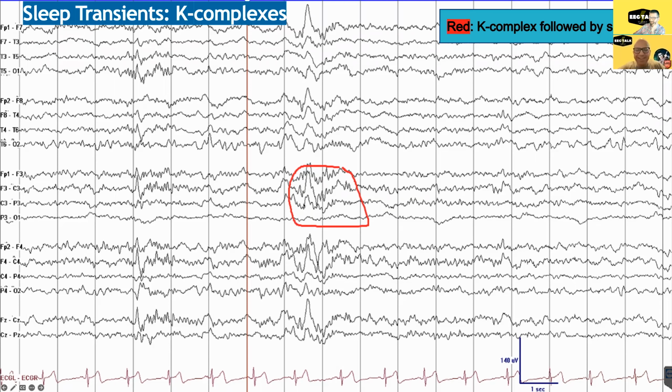You almost convinced me for a little bit. They're big delta waves. I think they often look like this, a little bit of an asymmetric triangle, and spindles often go with them. Here's an example, right? Some spindles there and the K. Yep. I think there's one over on the left as well.